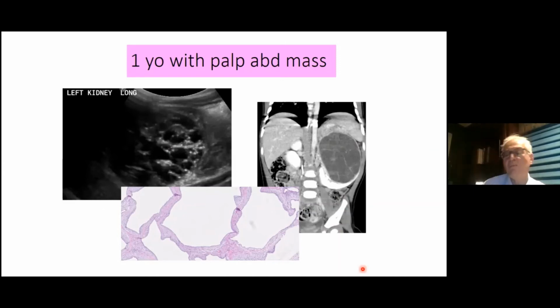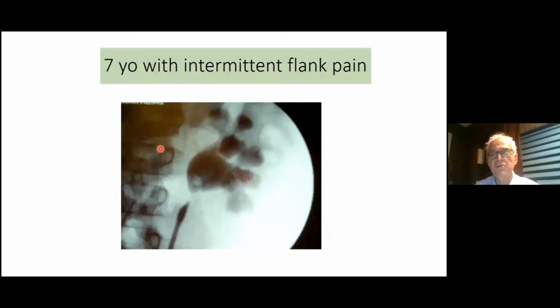A multi-cystic nephroma, I think. We call them multilocular cystic nephroma. Good guess. Wilms tumors certainly could occur, but this looks a little different to me than that. I think this kind of appearance is more like a multilocular cyst. Okay, great. Okay, how about this one?